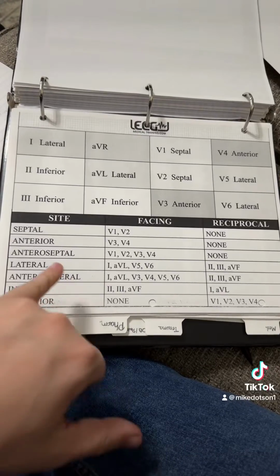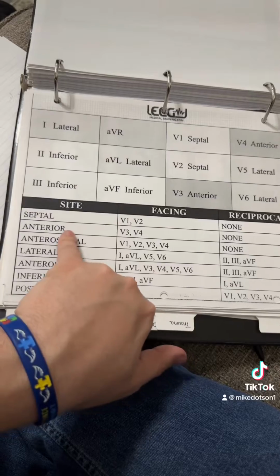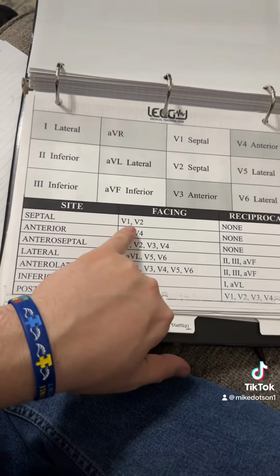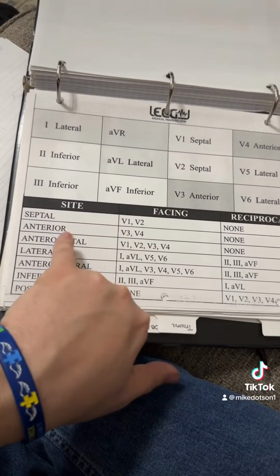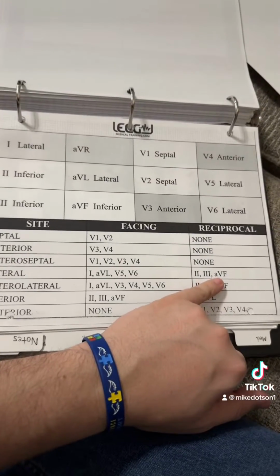This shows each site. If you have elevation in V1 and V2, that would be a septal wall MI. If it was in V1, V2, V3, and V4, that's an anterior septal MI. What this is talking about over here is reciprocal changes.